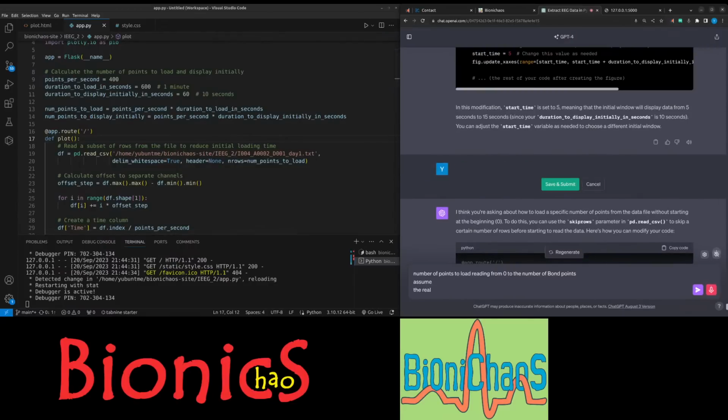The real question is, how do we move along the file beyond the number of points to load?